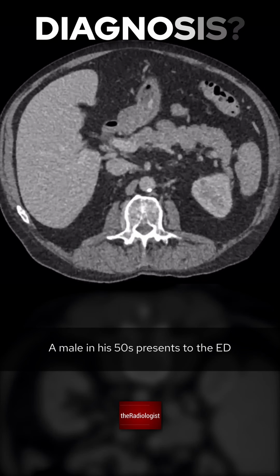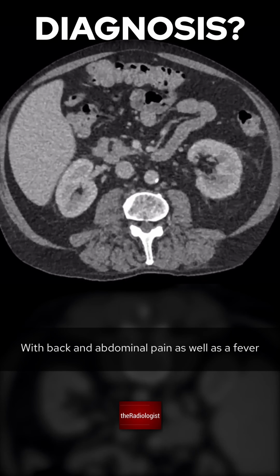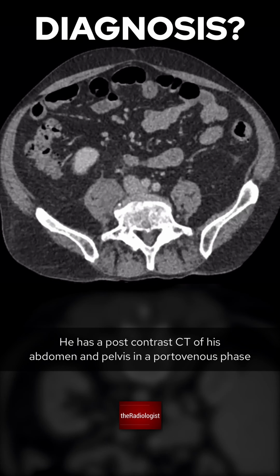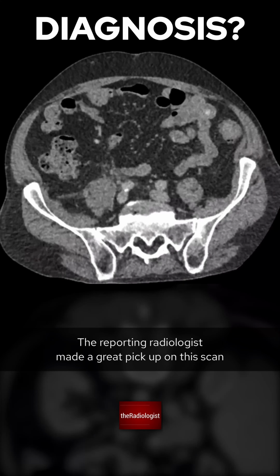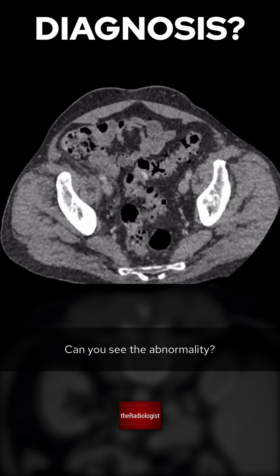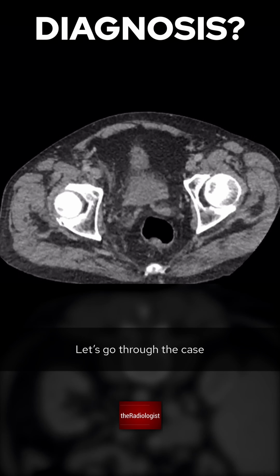A male in his 50s presents to the ED with back and abdominal pain as well as a fever. He has a post-contrast CT of his abdomen and pelvis in a portovenous phase. The reporting radiologist made a great pickup on this scan. Can you see the abnormality? Let's go through the case.